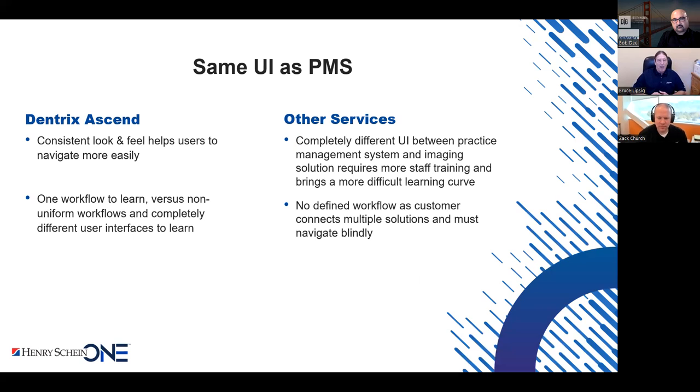Well, the imaging and the practice management aren't different applications. They're identical, with the same development teams putting them together. And what you end up with is something that looks and feels like you never left, because you did never leave. The buttons are in the same place, whether you're in 2D, 3D, CAD CAM. They draw, they measure, they zoom, they rotate, they annotate, all from the same areas in every modality. You're not searching different applications to then find different buttons to use to be able to work the application. All the same look and feel in the UI really benefits the team members as they continue to go through the daily routines. Yeah, exactly.